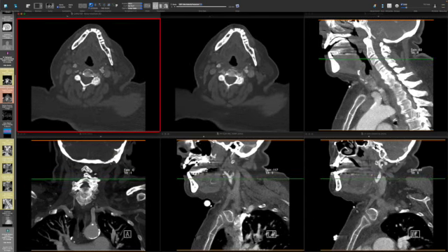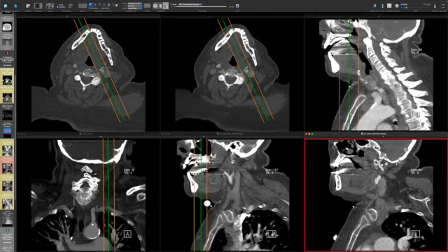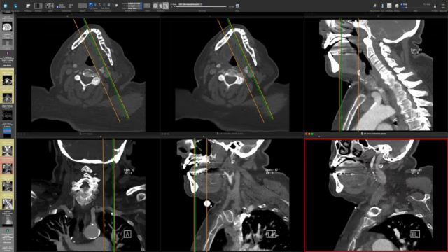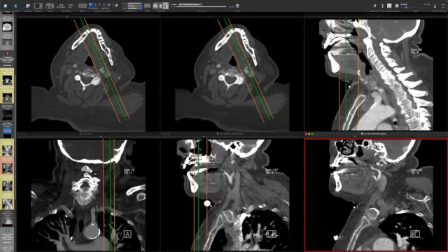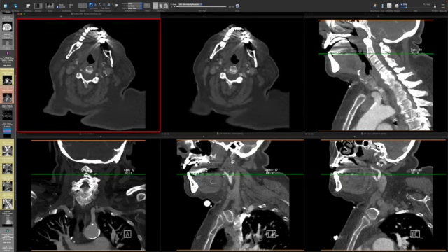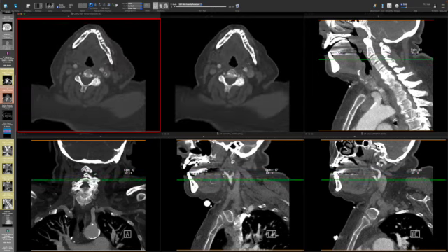So if we go to that nice reconstruction, that oblique sagittal reconstruction, here's that left side. You can see the left common carotid artery. Here's the bifurcation into the internal carotid artery and external carotid artery. Those two are easy to tell apart because the external carotid artery has a bunch of different branches, and the left internal carotid artery is an expressway all the way to the brain.